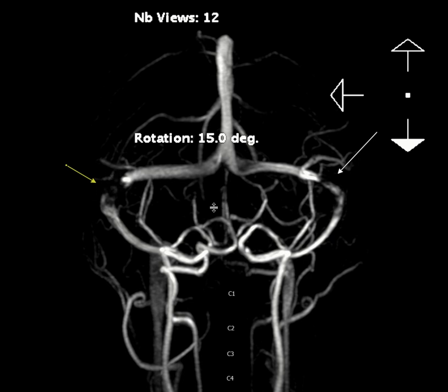So basically, this is one of the most specific imaging findings for IIH. So when I see this one, I'm just more confident to call it IIH. And they can do venous stenting when it is severe, such as this case, and then it can cause some relief for the patient's headache and other symptoms that they might experience.